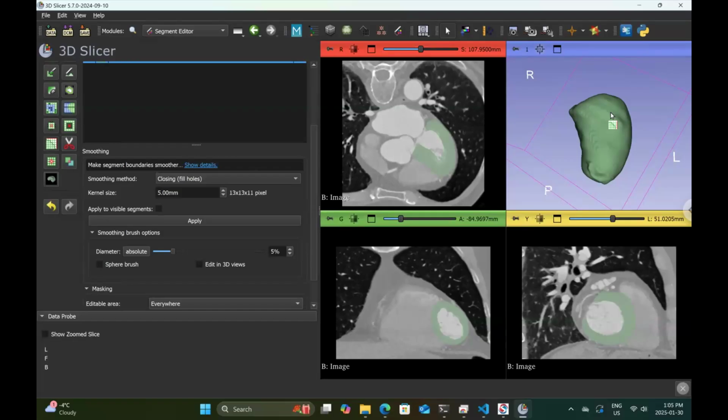Aorta you can do in the SimVascular software. This is the only non-SimVascular software you would have to use, for segmenting the ventricle. So we're just sticking with the left ventricle.